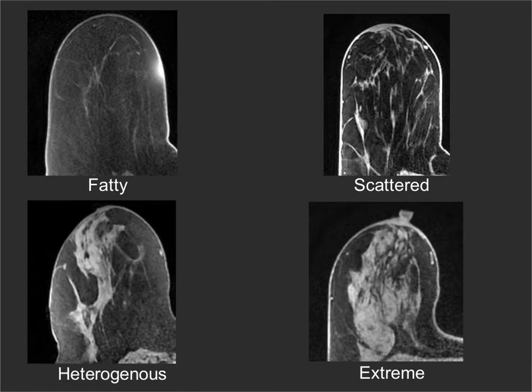Now, do remember, however, that the difference between an MR and the mammogram is that you do need to scan through all the slices to get a real idea of the 3D volume of these tissues. I find that either using the fat-suppressed T1 pregadolinium or the non-fat suppressed T1 images are most helpful for this, but I often go back and look at the mammogram as well and just make sure that I'm being consistent between the two.